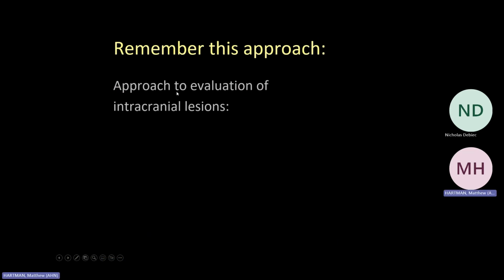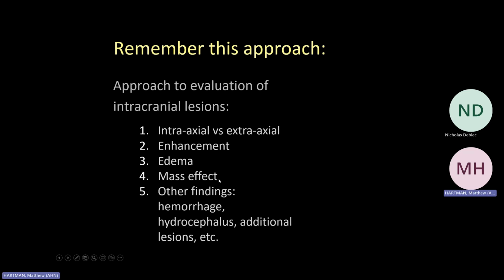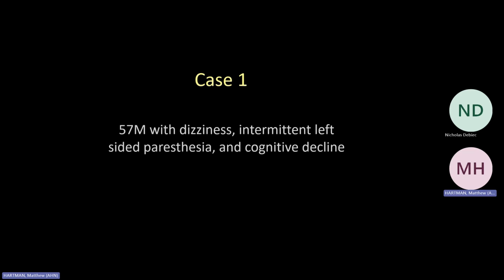Okay, so speaking of our stepwise approach, let's go over it. Intraaxial versus extraaxial. Is there enhancement? Is there edema? Is there mass effect? And then looking for the other important findings, hemorrhage, hydrocephalus, herniation. So using this approach, we're going to go through some cases, and we're going to have some good RadPath.